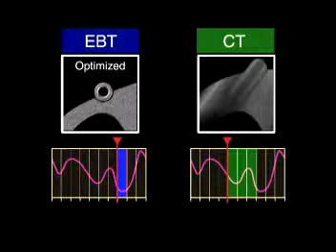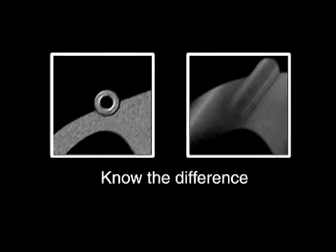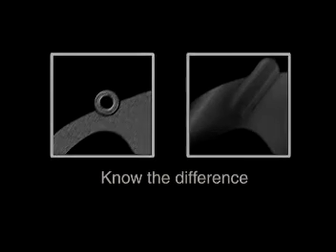While the image acquisition time of the EBT technology is more than 3 times faster than the fastest CT, an analysis of triggering and complex coronary motion yields a profound scientific result. EBT technology often images the mid-RCA with over 20 times less displacement.